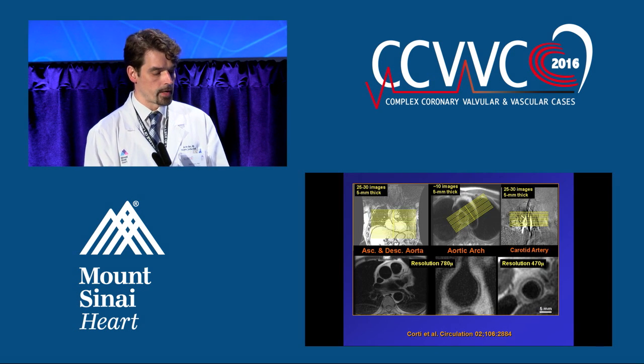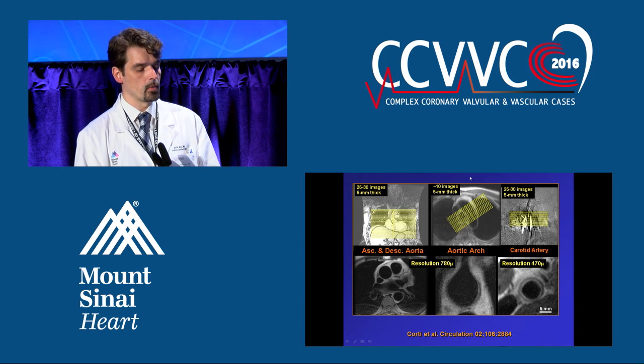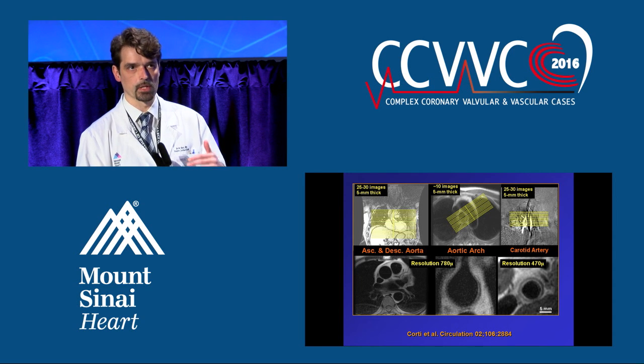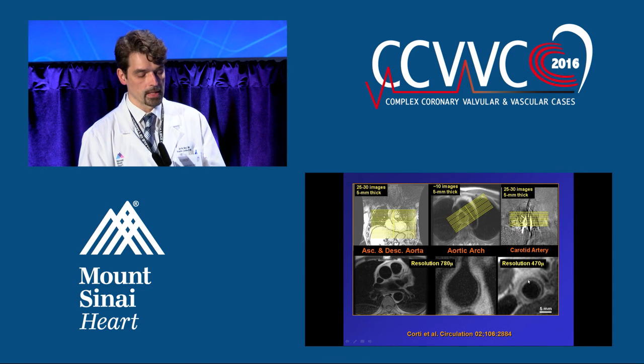Now, if we go into MRI, with MRI, we use a technique which is called black blood imaging. I mean, there are many different types of MRI acquisitions that we can do, which are called MRI sequences. The most common is the black blood, where the blood obviously is dark, and we can see the vessel wall right here in the different vessels in the body.